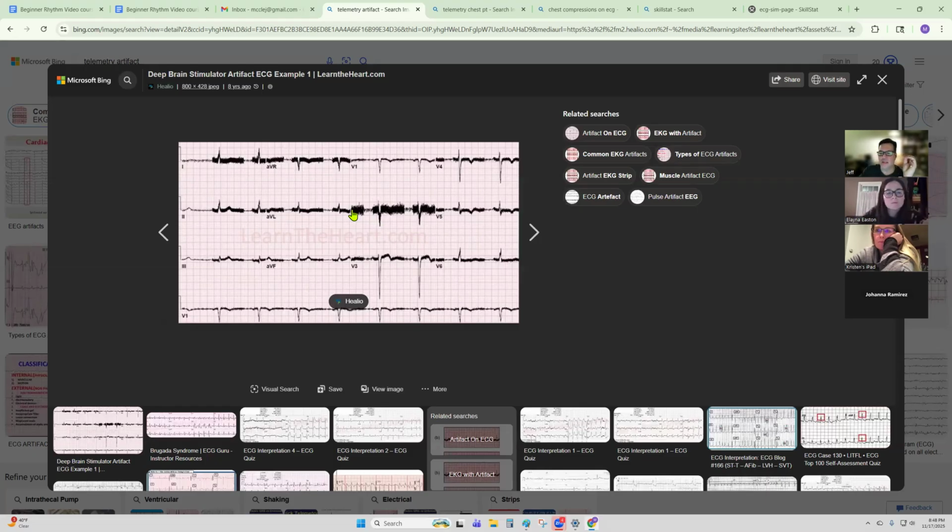And all that is the telemetry picking up this electrical interference from someplace else, some other device, be it cell phone, could be another implanted device, be it muscle stimulator or something, or could be anything. So that's called 60-cycle or electrical interference. But you should still be able to see the activity underneath all that. Like, you still see the QRS complexes.